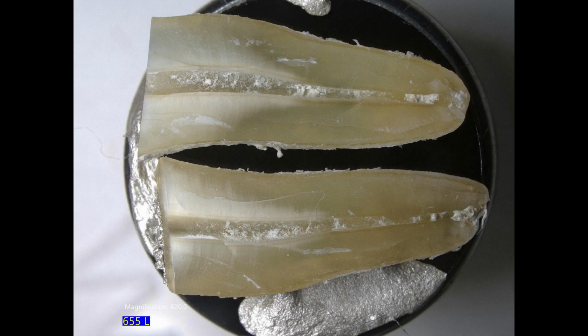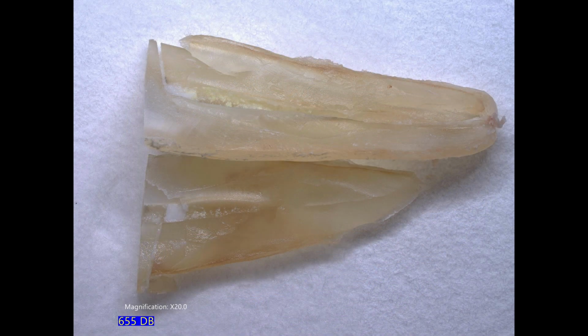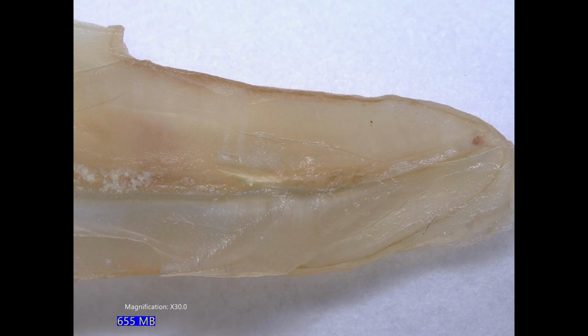When I got the tooth, it was a fused root on the buccal side. So I was able to section the buccal root from the palatal root, and those are my radiographs showing the fused root. We did split the root sagittally, and we got fairly decent sagittal splits on the mesiobuccal, distobuccal, and palatal roots.